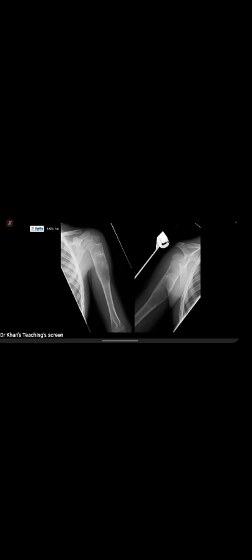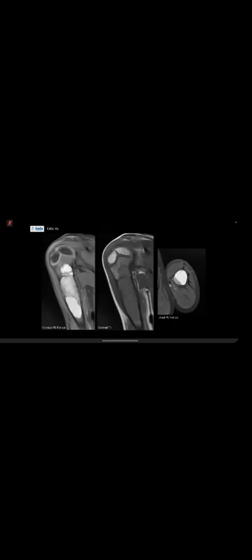So again, any other ideas? If this is in your A&E emergency department plain film reporting pile and the patient presents with a fall, what would you be suggesting? Would you be suggesting anything? I would further take up the patient for cross-sectional imaging. Okay. Can you think of any other conditions that occur in this region? Don't worry if not. If I show you an MR?